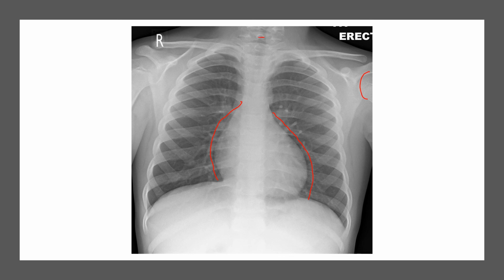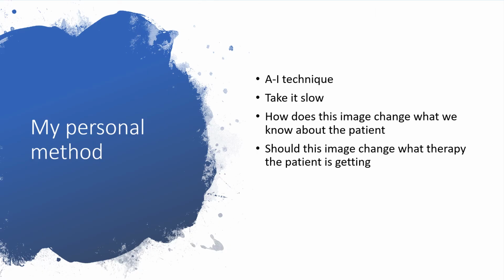You can see the spinous processes through the trachea, so this patient's lined up directly. This kid has some viral things going on, but that's a whole separate issue. You're still going to have a little bit of abnormalities compared to an adult one, mostly that cardiothoracic size. This is like a 6- or 7-year-old chest x-ray, somewhere in that area. So it still hangs around for a little bit until you get to the teen years.